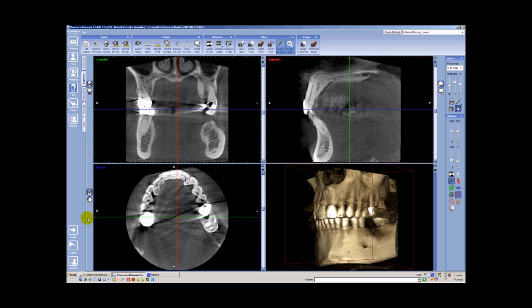In this tutorial, we will discuss the layout of the Explorer window. Currently, what we see here on the screen is the default layout of the Explorer window, which is the first window you're presented after capturing a three-dimensional volume. With this layout, it's actually pretty intuitive.